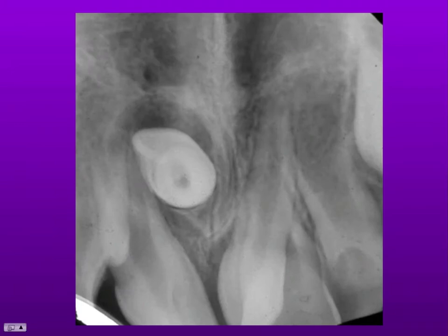This patient is a little more unusual, but not unique, in that they have 2 mesiodens. This is the midline here. This is the right nasal cavity, the left nasal cavity. Here is a mesiodens which is transverse in the arch, and we're looking down the root canal. You can also see that the follicle around the crown of the tooth is a little bit widened from a normal situation. It's possible that this is undergoing a cystic change. And I would certainly want to keep a close eye on this, even if I didn't do anything about it now.